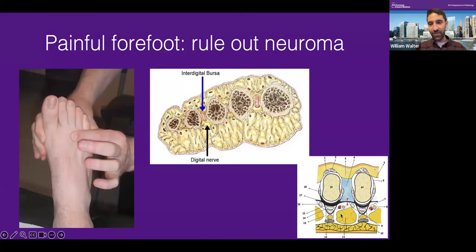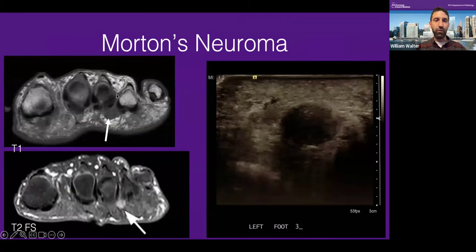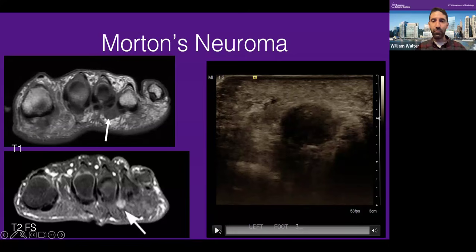And so it is said that a neuroma should extend more plantar and a bursitis will be more directly between the metatarsal heads. So here's a Morton's neuroma on MRI. It usually forms this pooching ovoid mass extending in a plantar direction. It's slightly T2 hyperintense here. It's not fluid bright. It's somewhere in between, kind of a brighter gray color here. And it looks mass-like. And so that's a very classic Morton's neuroma.